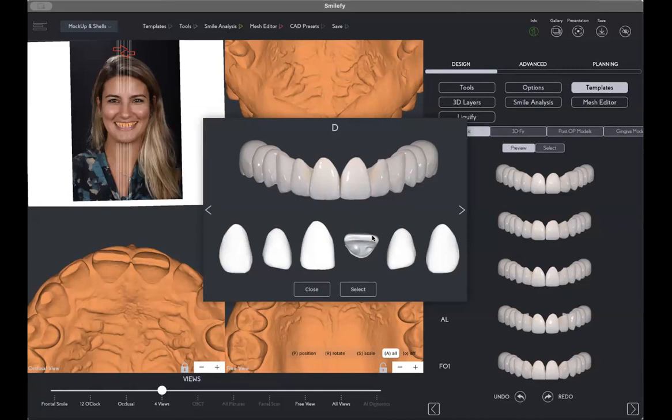So it's going to be very hard to match, to cover the buccal surface, and you will be forced to deform the tooth in a very, very ugly way with the deformation tool and all the stuff. And the incisal edge is going to be too thick, too big. It's not going to look good.